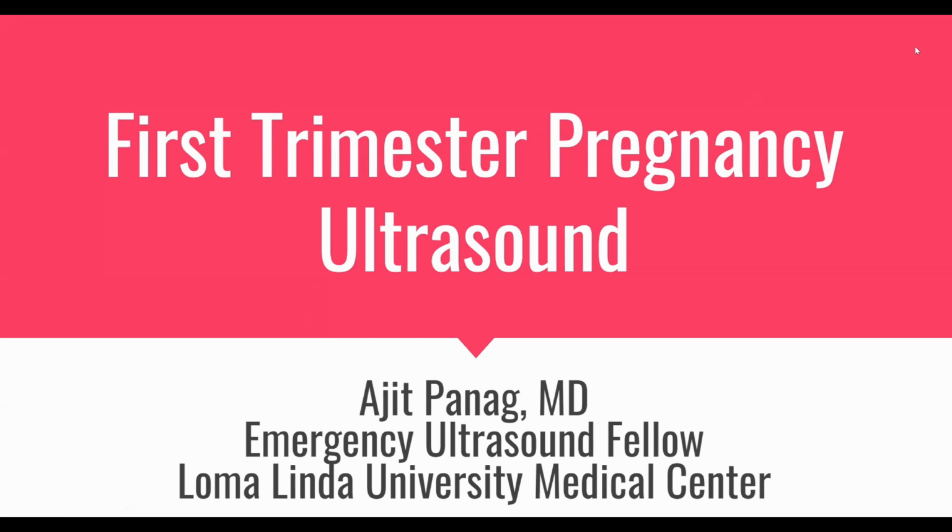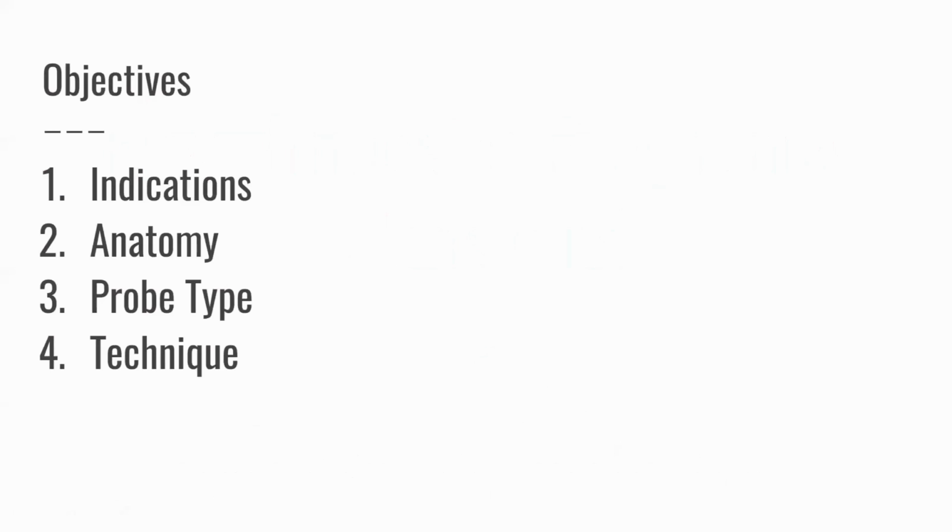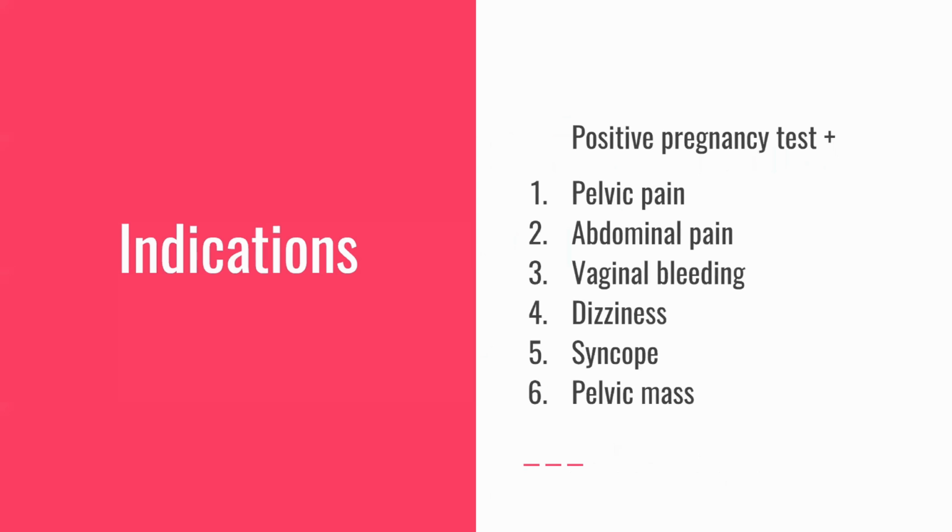Today, we're going to be talking about first trimester pregnancy ultrasound. We'll be going over a bit of a review of indications, some anatomy review, and then we'll talk about probe types, some of the technique, and some of the pathology involved. So first of all, what are some of the indications for first trimester ultrasound?